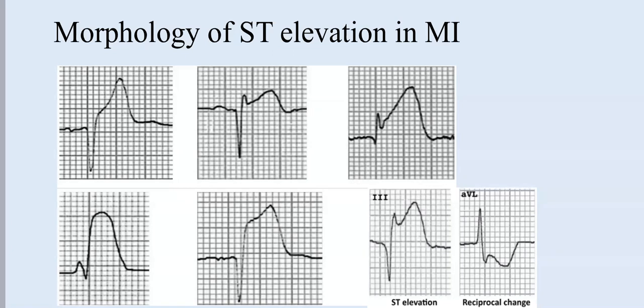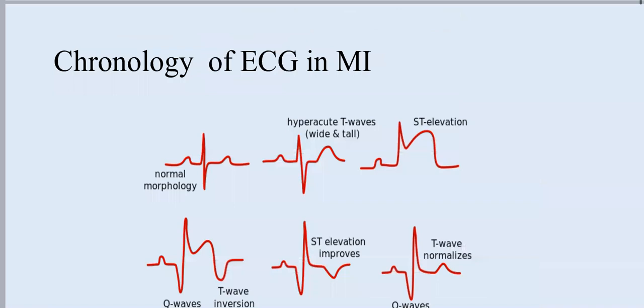Okay. The timeline for the ECG changes in STEMI. Initially, the one on the left is what you usually have, and as ischemia kicks in, you can have hyperacute T-wave, and we describe that, followed by the ST segment elevation, but still you don't have Q-wave. It means there is no complete necrosis yet. There is injury, transmural injury, but no necrosis yet to cavitate that segment.